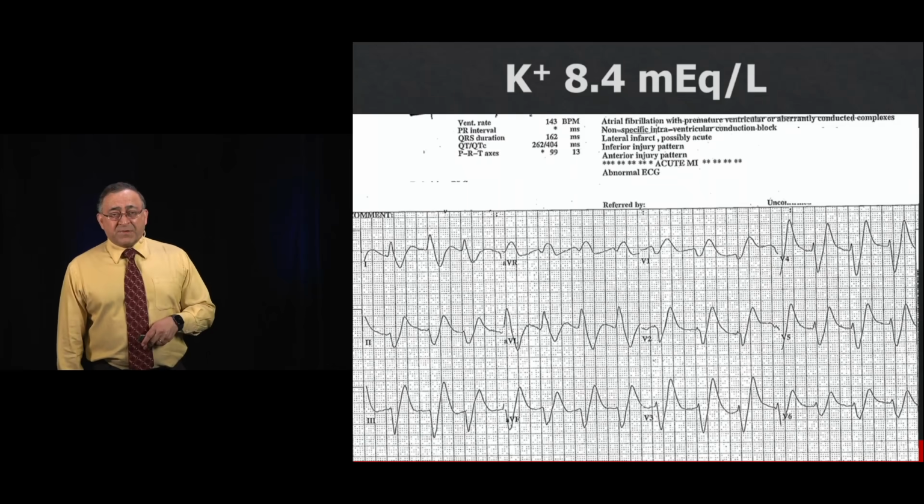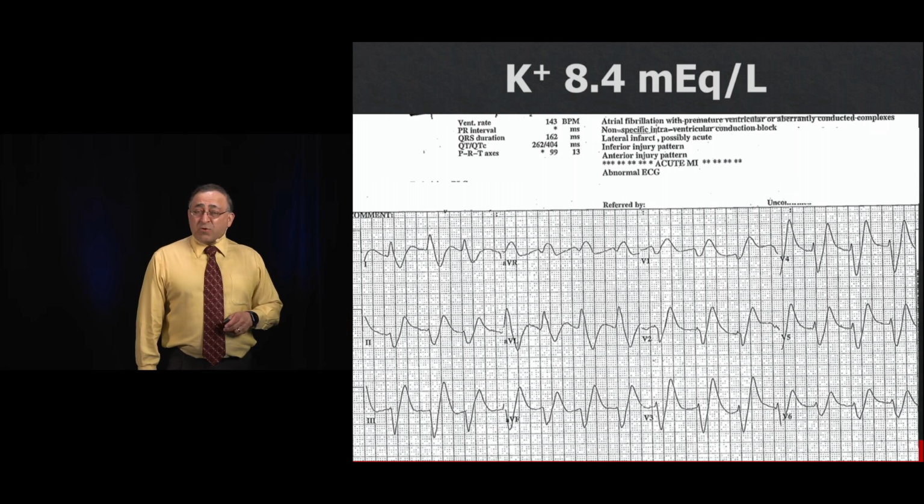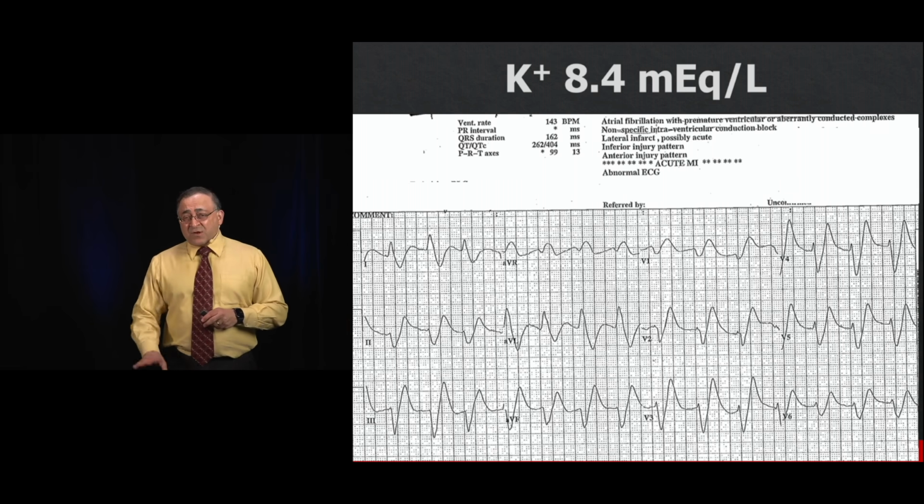Let's look at some more examples here, all right? This is pretty severe hyperkalemia. You're approaching a sine wave. Notice the computer doesn't know this.